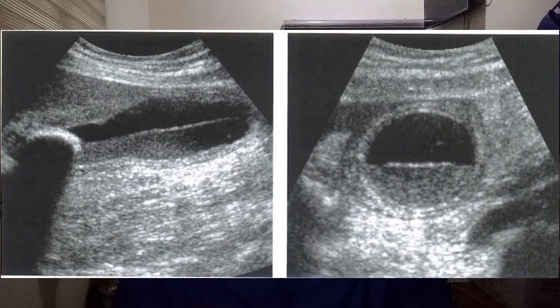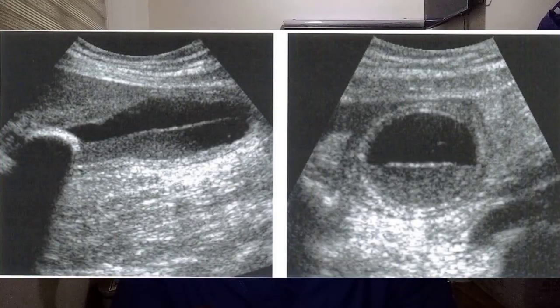Welcome back. We'll begin this discussion looking at the spectrum of acute cholecystitis in ultrasound. Take a look at this case, acute cholecystitis. Here you see a distended gallbladder with wall thickening. You observe a fluid debris level and an obstructing stone in the gallbladder neck. You see the sagittal view and the transverse view of the same image.